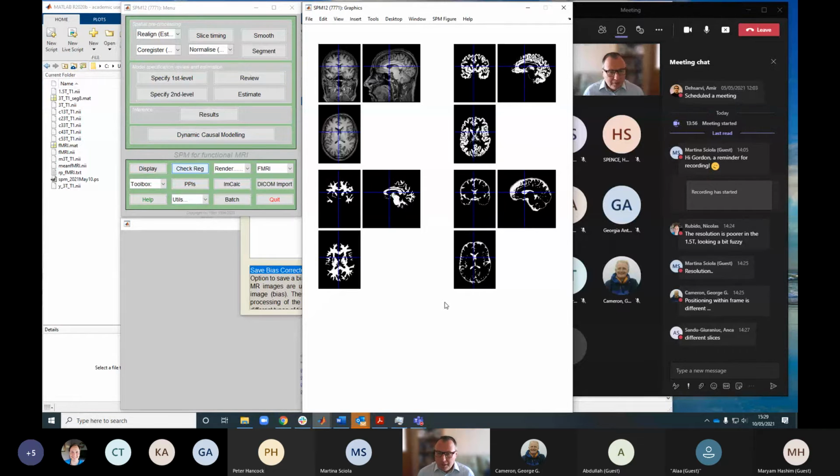That's important because that template gives us a standard anatomical map that we can use, and it's the same standard anatomical map that lots of other groups use. It came from the Montreal Neurological Institute, where they took lots of people and pooled their data together. I'm saying average, it wasn't quite what they did, but they created a standard template. And not only SPM, but lots of other software that do similar things use the same standardized template.